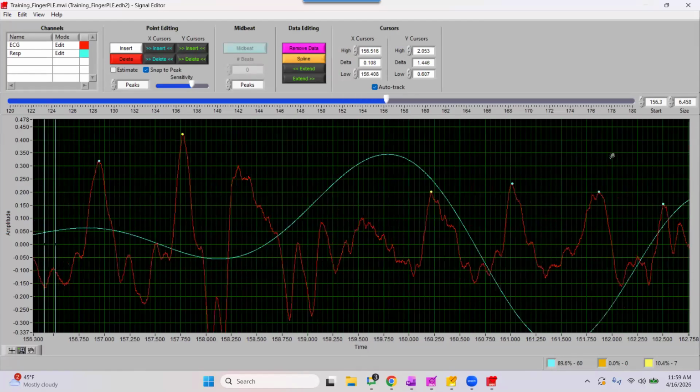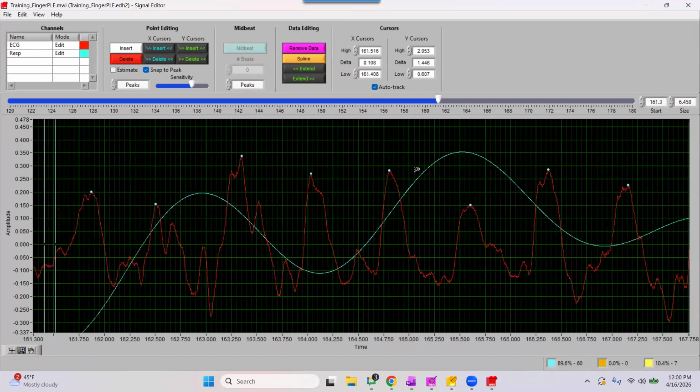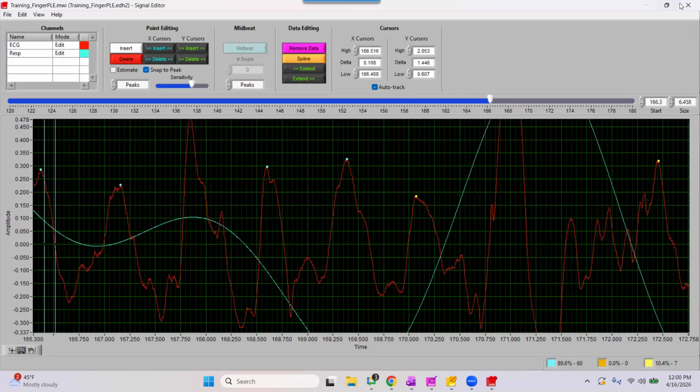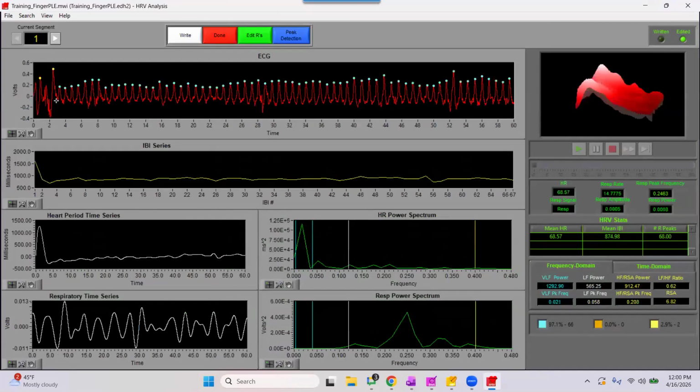to retain this data, but it may be that you have data that is so shaky that we are misidentifying these systolic peaks or don't have a clear indicator of our systolic peaks, or just that due to lack of definition, we don't get the accuracy of the timing. So it may be that you have some very good sections of data, like segment 1, where we had really well-defined peaks.